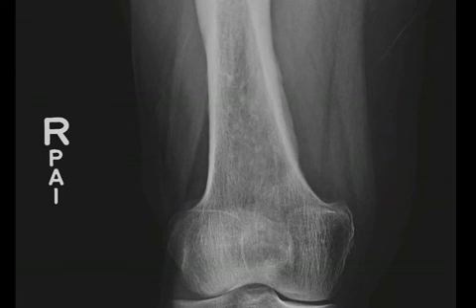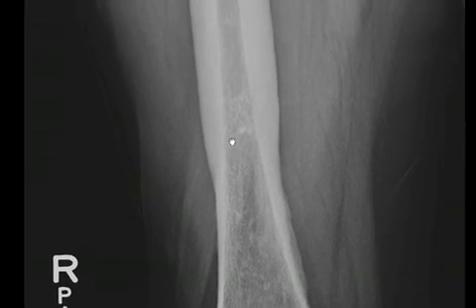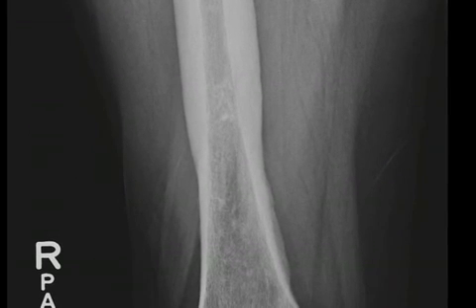In summary, this patient has a relatively long lesion of the femur with a somewhat mixed appearance. The proximal part is consistent with a chondroid lesion. The thickening and extent of the lesion are all making it consistent with a chondrosarcoma, and this patient underwent excision of the entirety of the femur, confirming the diagnosis.